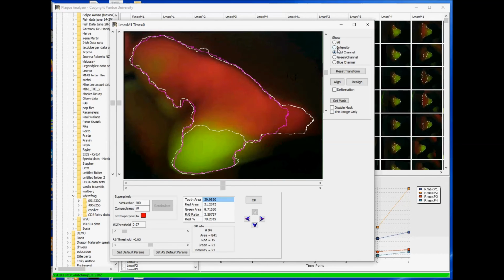And then if I set the green channel intensity, I can look at all of them, and let's say I want more green channel here, then I would just move these. And again, you can use these larger superpixels, or you can make the superpixels smaller by changing this number here to whatever number, recalculate, and you will see larger pixel area. And again, I will reset them here because I did a recalculation.